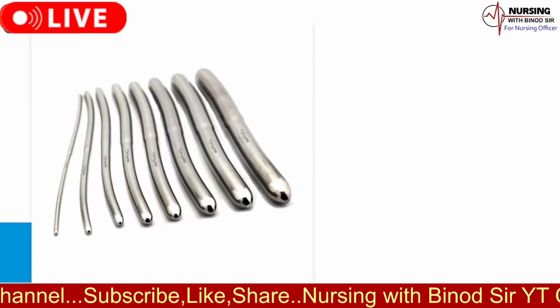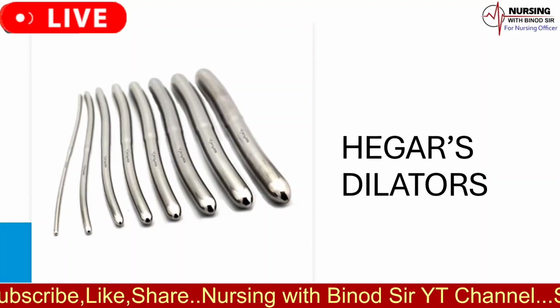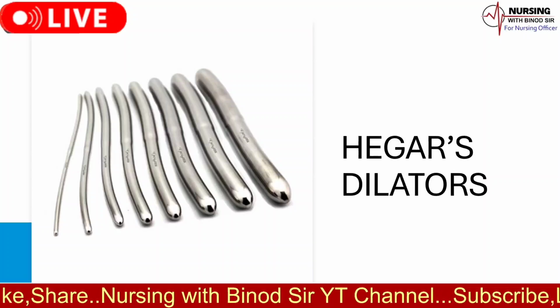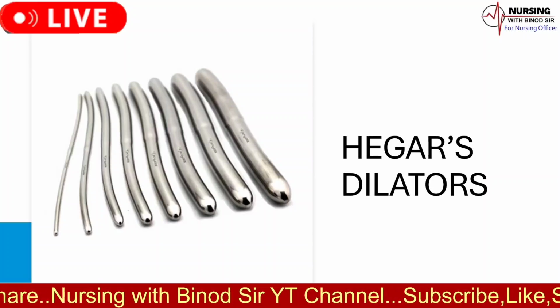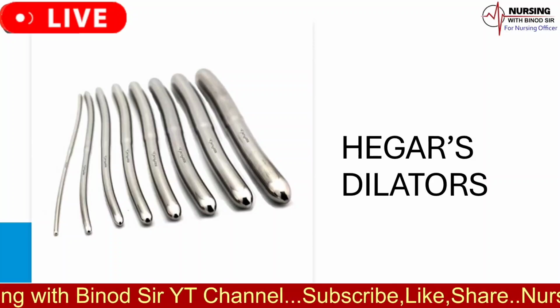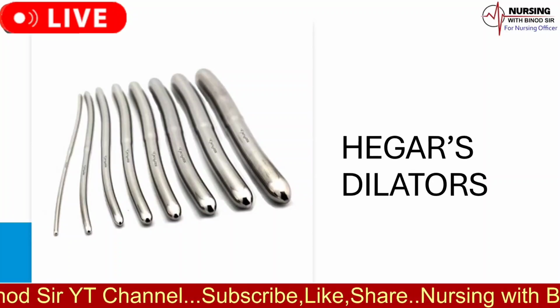The name of the instrument is Hegar's or Das dilators. The uses of Hegar's or Das dilators are as follows. It is used in dilatation of the cervical canal prior to evacuation operation, depending on the degree of dilatation required.